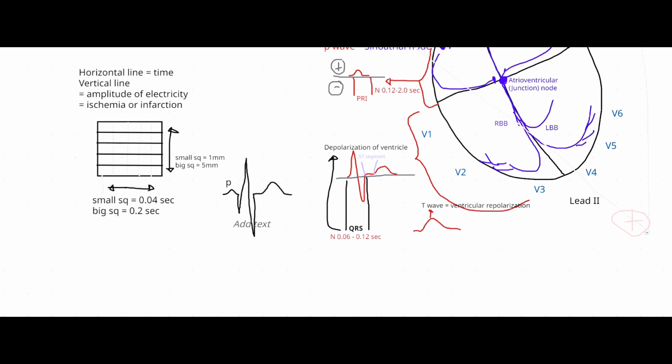Okay, I'll tell you how you know in a minute. R, if you notice, is the highest amplitude, right? Because that's at the peak of the contraction of the heart. Okay, and then S, and then the T. So let me go back to my question here first, and then I'll come back to the Q.